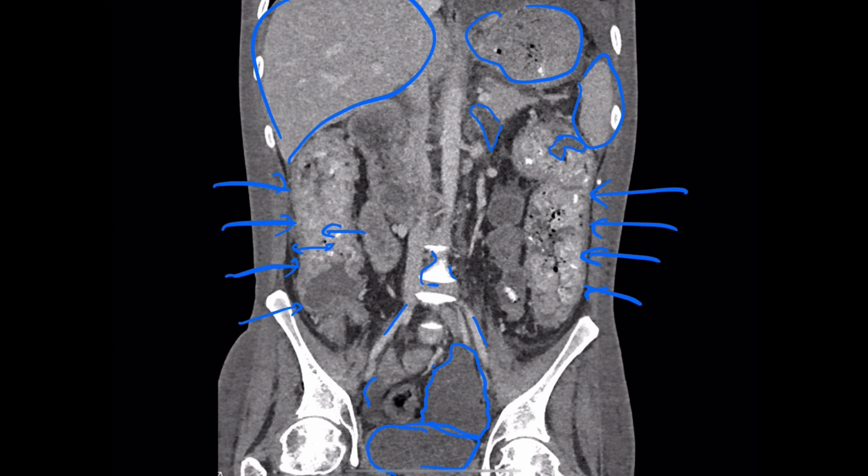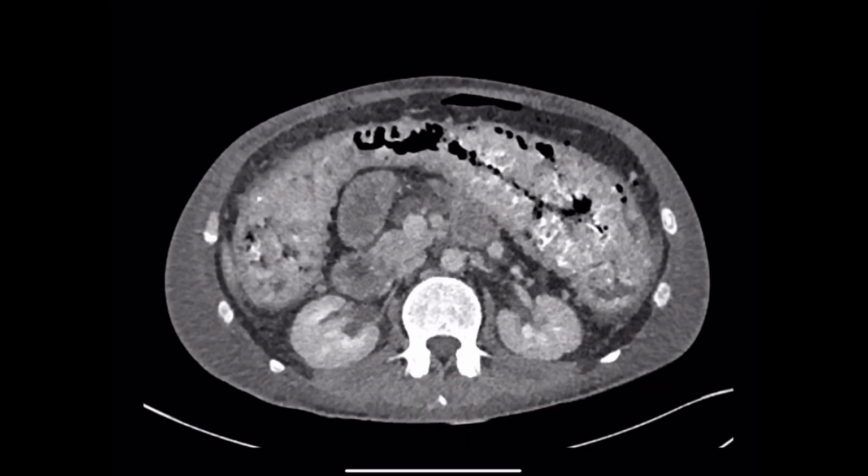Whoa, okay. Which this is outside bowel. So what you've delineated there are like sumps of fluid. So it's sumps of fluid, in the presence of really gross inflammation. This is not good. Not good.